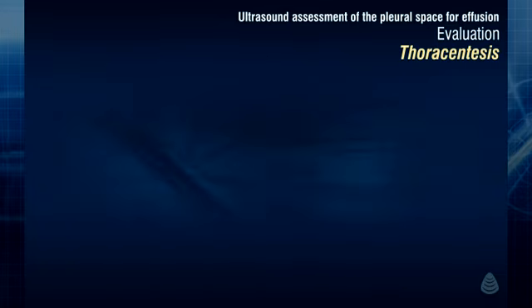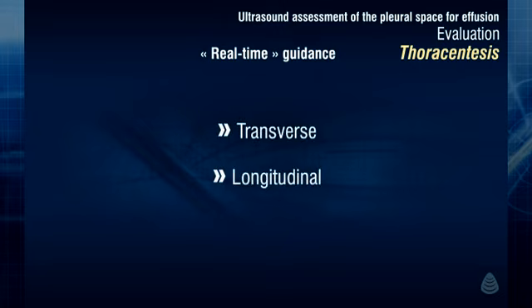In some circumstances, a thoracentesis will need to be performed with real-time guidance of the needle in the pleural fluid collection. This may be the case when the collection to be drained is small, loculated, or when it's localized very near organs previously described. The real-time guidance of the needle will need to be performed following the exact same principles of ultrasound guidance that were thoroughly reviewed in the curriculum on assessment of central and peripheral vessels using either the transverse or longitudinal approach.